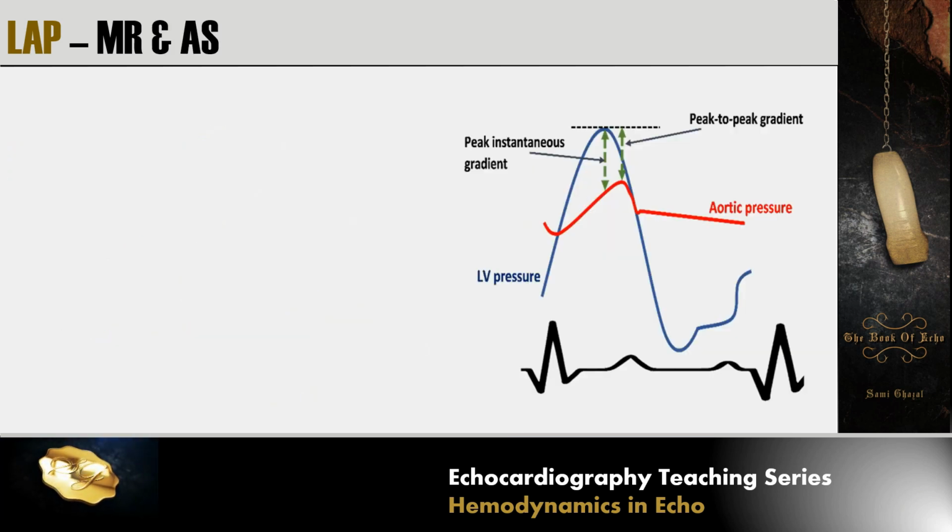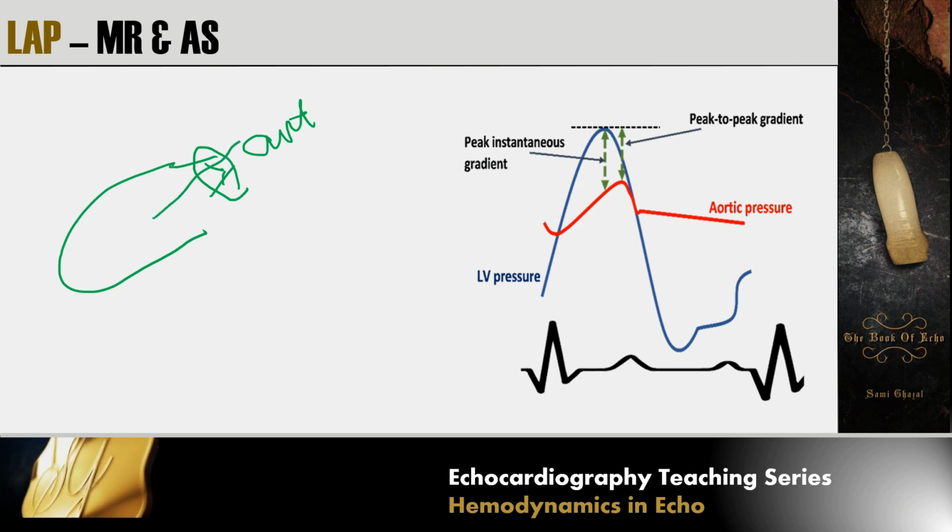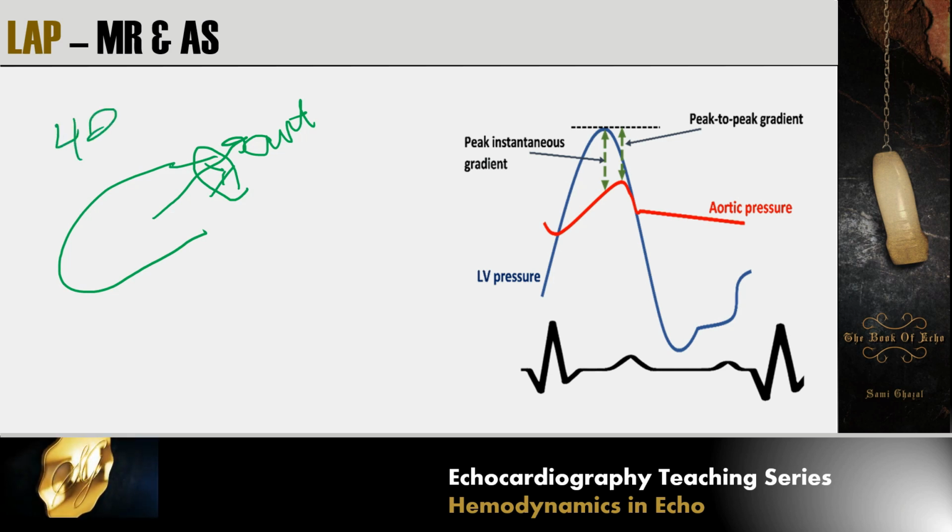In the presence of aortic stenosis, things can be really complicated. Let's say that this is the LV here and this is the aorta here, and this is the aortic valve, and there is significant stenosis. So we have a gradient, and if we measure this gradient with our continuous wave Doppler, let's say it's 40 millimeter of mercury.